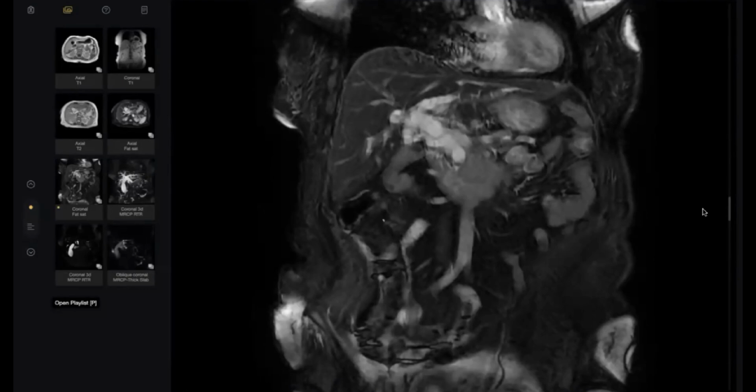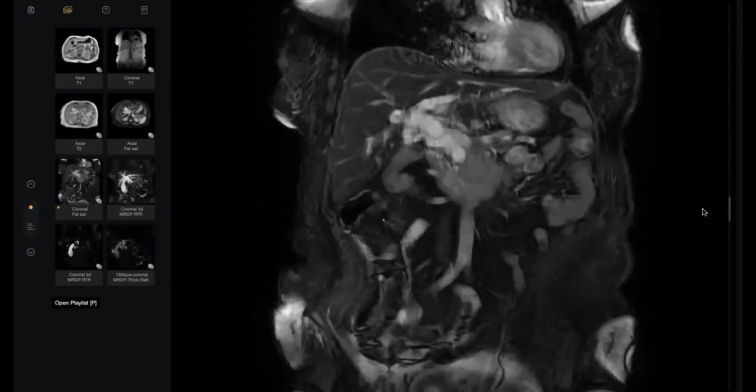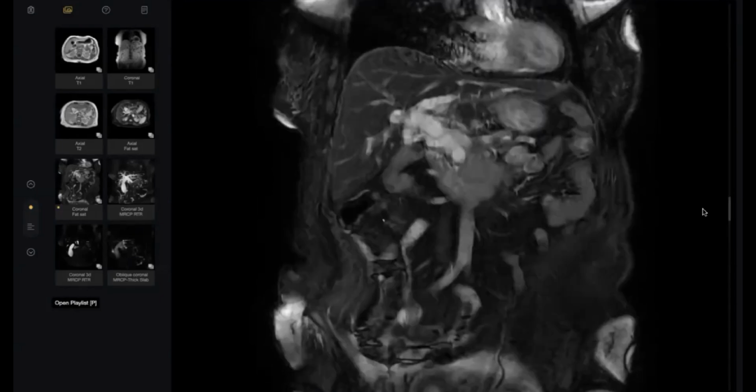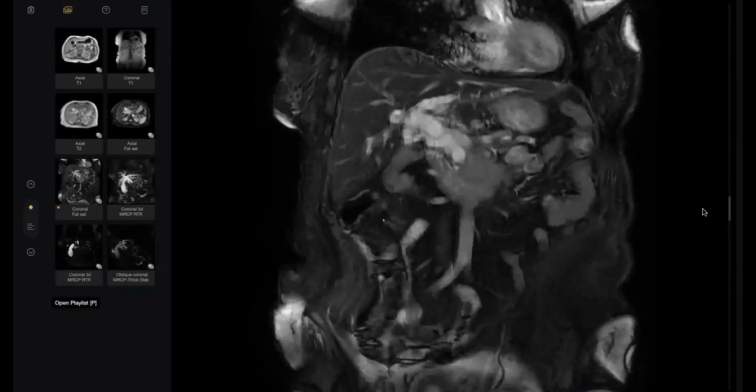Okay. Excellent. Can I see the distal part? No filling defect in the distal part. So, considering the age of the patient as well as intrahepatic biliary dilatation, there could be a stricture in the distal bile duct, which could be cholangiocarcinoma. I would refer the case to the hepatobiliary MDT and advise the ERCP as well as biopsy.